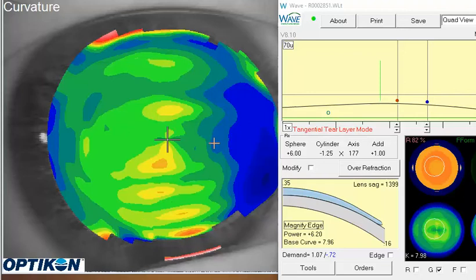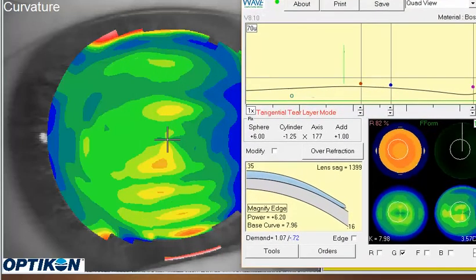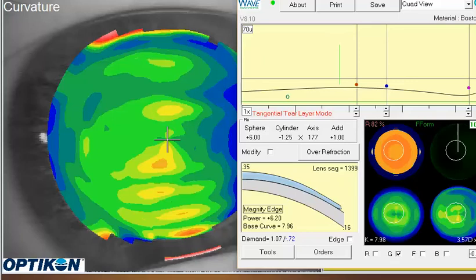So ideally you want to design off as much of this corneal surface as we can design with. And to do that, I see why you chose the G-SIM, which is a nice concept. One thing I would probably consider doing when you open up this design, instead of averaging out the corneal astigmatism, I would try to not average it out. Sometimes the averaging tool will hide some of the unique corneal topography, thus affecting the overall fit.